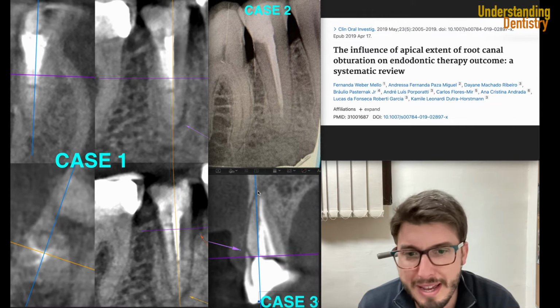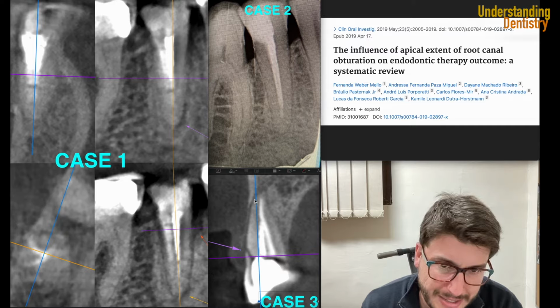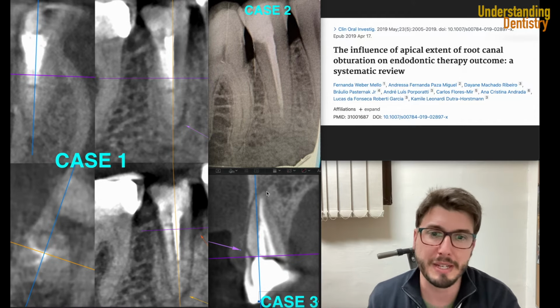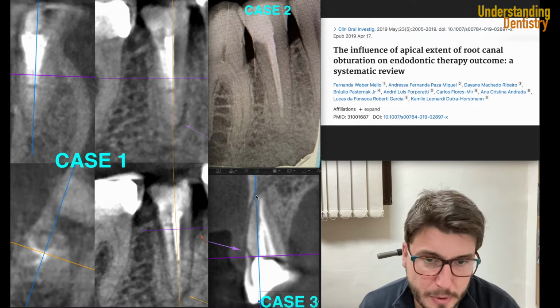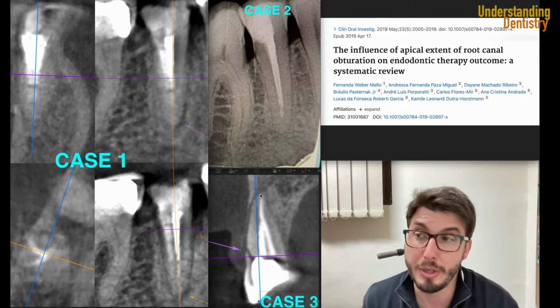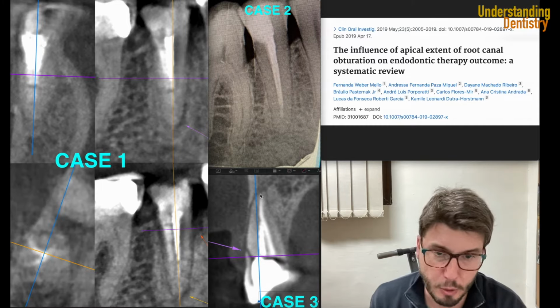And then you have, well, this could still be classified as periodontal ligament space widening, but versus periapical granuloma, right? Because now we do have a situation here that it's a hypodense lesion, okay? So it's the beginning of a periapical granuloma, all right? And that's basically what happens. The periodontal ligament space, widened space, becomes now a periapical granuloma.